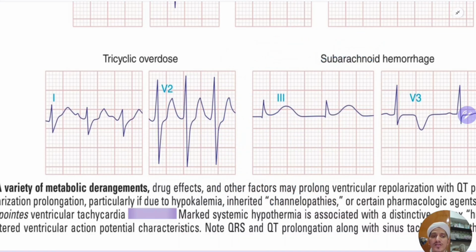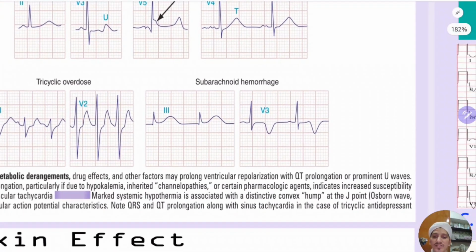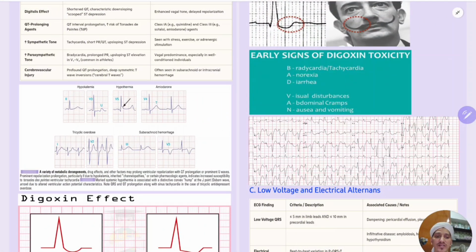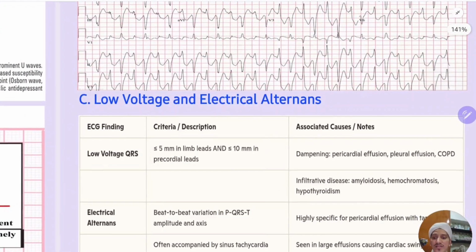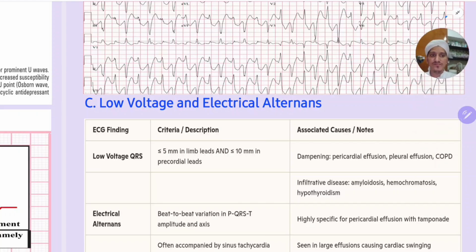Okay, I have already explained this: cerebral T waves, inverted T waves, gigantic in the chest leads in patients with some cerebrovascular event. Now the third thing I have to explain is this one. This will take time, nothing, don't need to worry, let it take its own time. So I'll take this one upside.